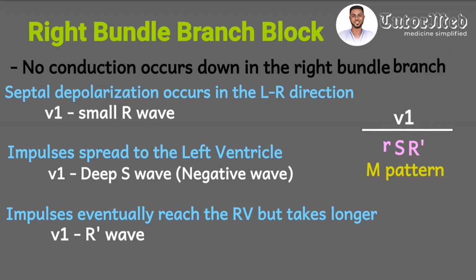Good. Also remember that due to the delay in the right ventricular depolarization, the entire QRS complex duration would delay, giving a duration more than 3 millimeters.